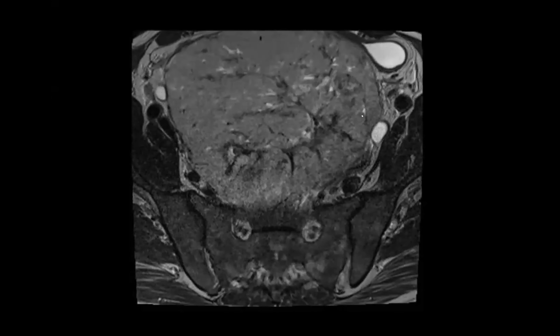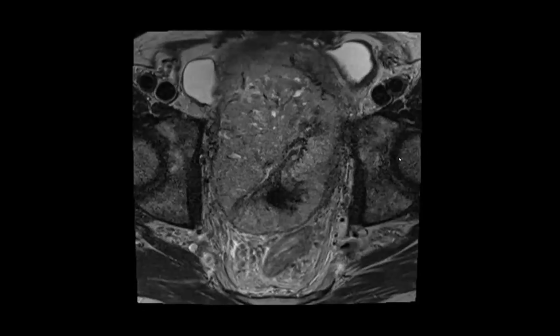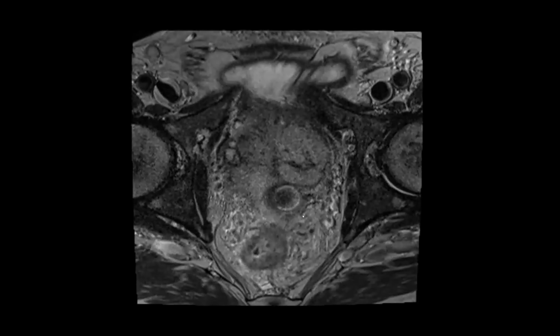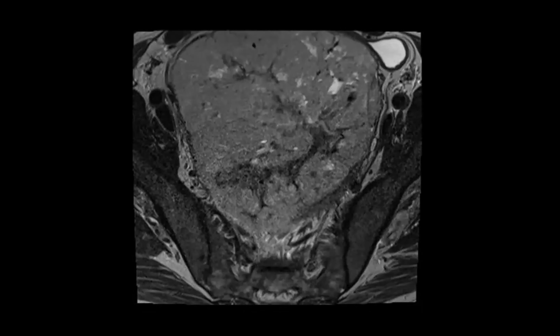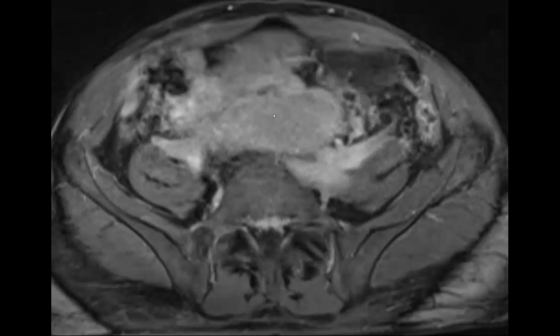Okay, this is my case. You can see that there's a large pelvic mass. The bladder's here. Prostate is here. Seminal vesicles here. What'd you say? Sarcoma. Okay, great thought. And we also thought about, for example, a stump tumor, which we've talked about here, where we get these large stromal tumors of the prostate. So anyway, here it is.